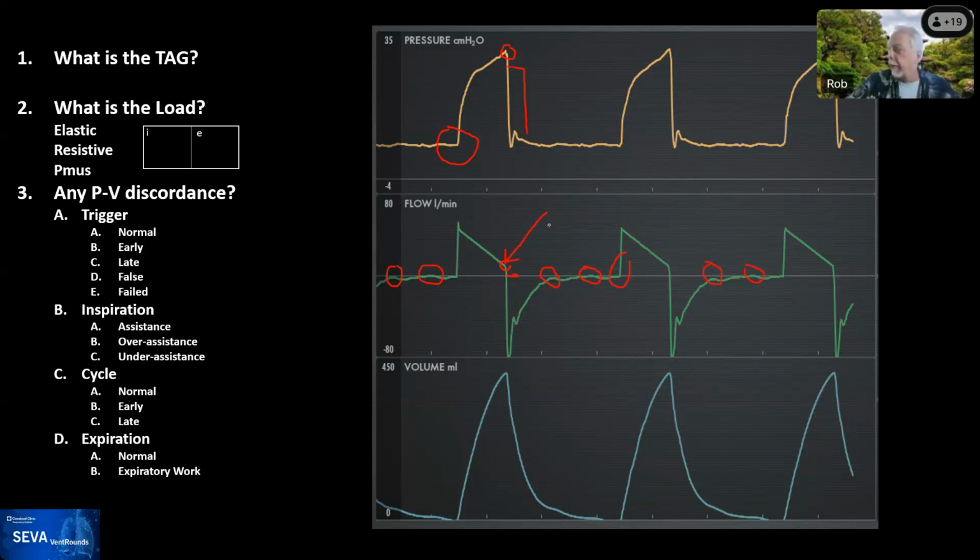Very good point. So the idea of looking at this end inspiratory pressure and saying that's plateau, it's only valid if the flow goes down to 0, and that's entirely a function of the clinician's setting on the servo ventilator and other ventilators as well. Good point, Ari. So let's get back to expiration.